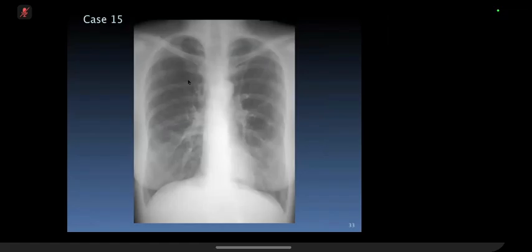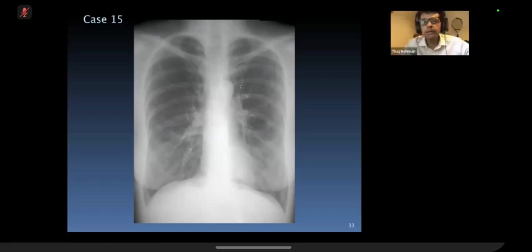So that leaves the vessels. I think there's increased vascularity lower and less in the superior aspects. I think it's slightly less vascularity in the right upper zone. It's fairly similar.